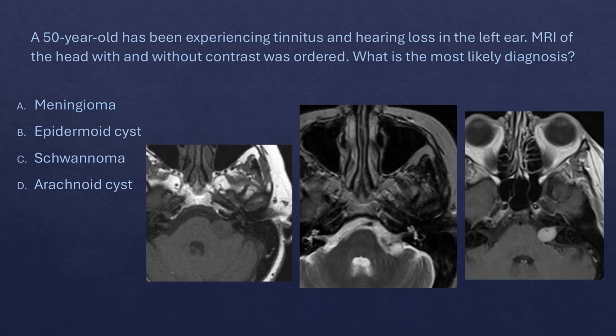Here's a slightly more zoomed in look at the findings. If you want, go ahead and take a moment here to pause the video and come up with an answer, and then we can discuss it.